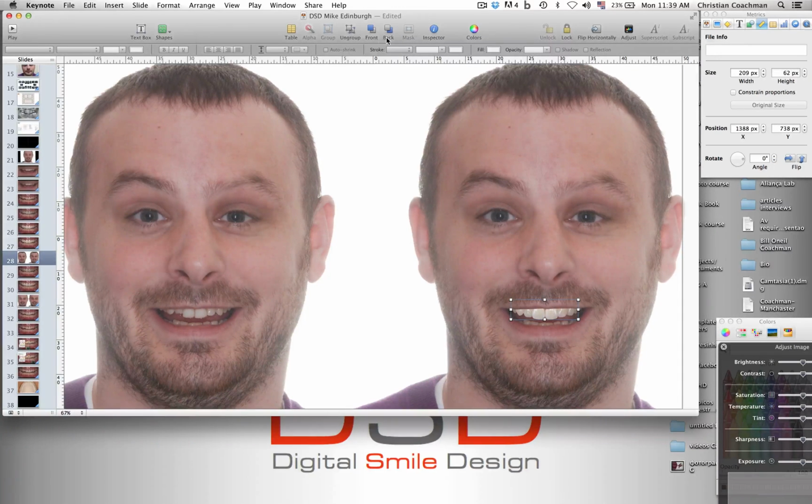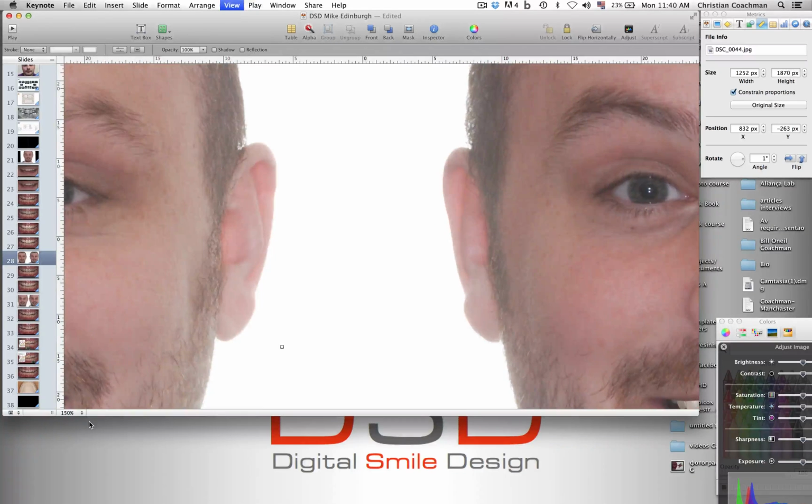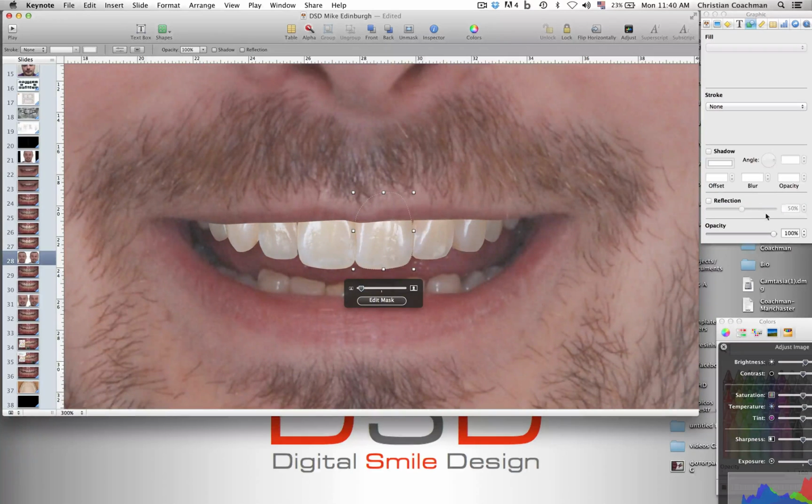Because up until this point, when you go back to the full face, you've not got the whole picture. You're relying on your reference lines to be absolutely correct. So you can fine tune over here. And then if you change the positions, for example, I can then zoom in, put some transparency, calibrate my ruler, and measure again. Remeasure what is happening here.